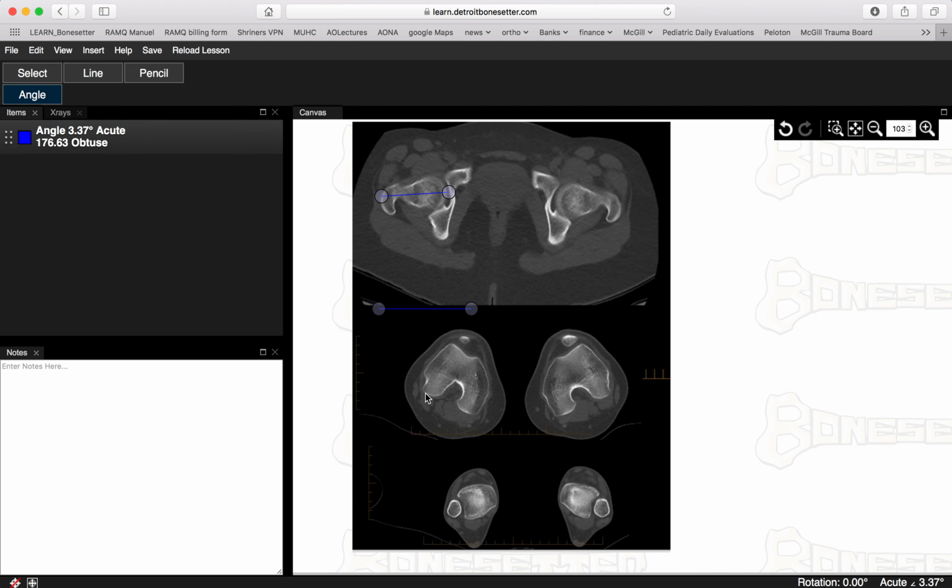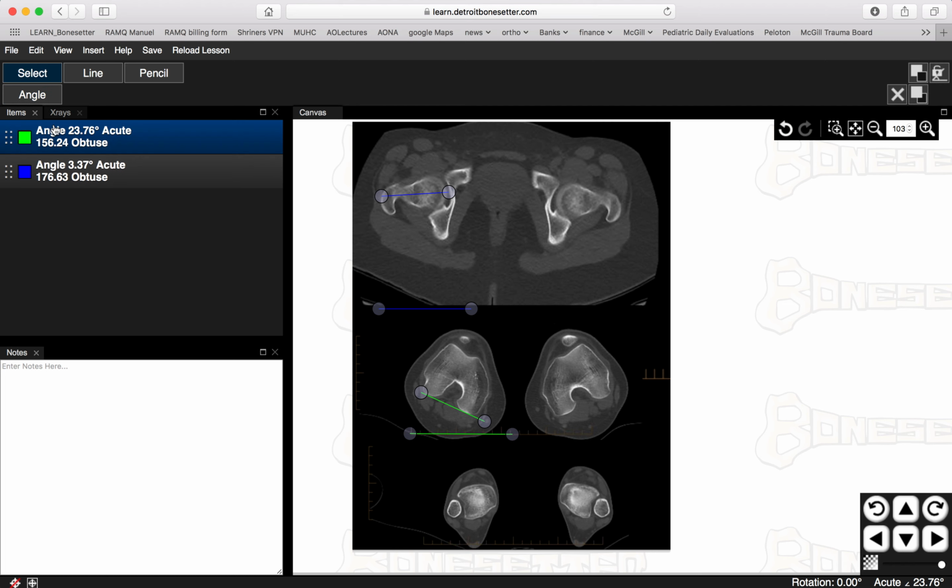flat to the floor. Another angle along the posterior femoral condyles, and a line flat to the floor. And similarly for the ankle, a line of best fit through the syndesmosis and a line parallel to the floor. Now I have described doing it perpendicular to the incisura, or you can do a line of best fit, and then you obviously want to adjust them to make them accurate, and really do your interpretation yourself and practice. You can do these on 2 different occasions to see how reliable you are at each set.